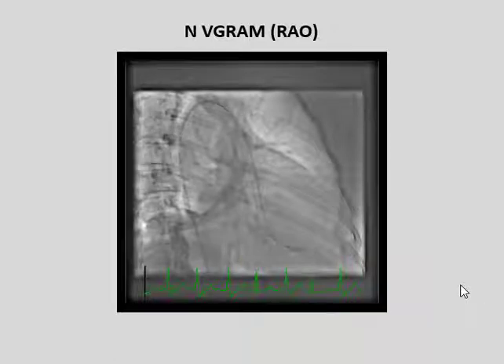Most of this lecture consists of straight-out AVIs, moving images, so it'll be a change of pace for you after the intensity of some of our preceding lectures. I think it's well deserved, but also you can't get through this term without having a good, thorough overview of what pathologies we encounter in the cath lab and what we do about it. Some we can correct there and then, others we can't.